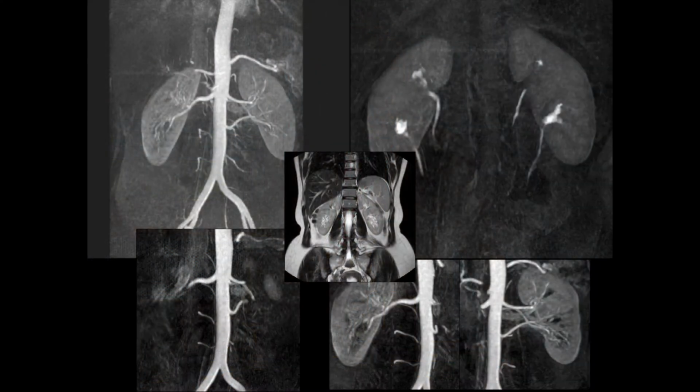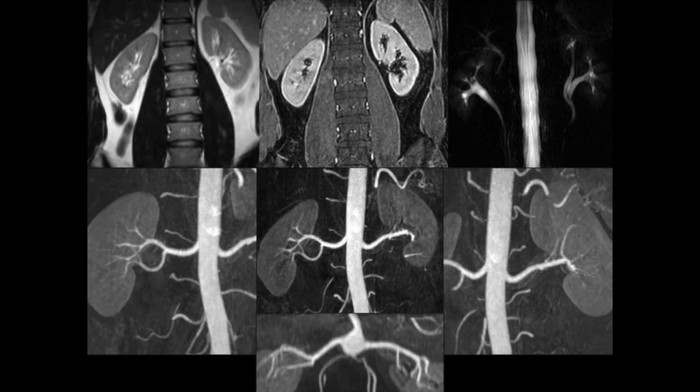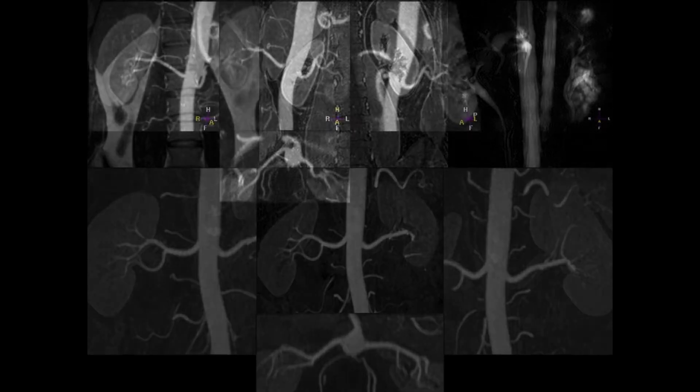And you can have multiple arteries, and in my experience, multiple arteries often also goes along with multiple ureters, because when they're plumbing in a kidney, they want to put in the arteries and the veins. They've also got to plumb in the ureters, and they're not going to take out a kidney that's got 2 ureters. So whatever protocol we do, we've got to look at the arteries, the veins, and the ureters. And again, as I say, they're not going to take something like this even with a bifid renal collecting system.